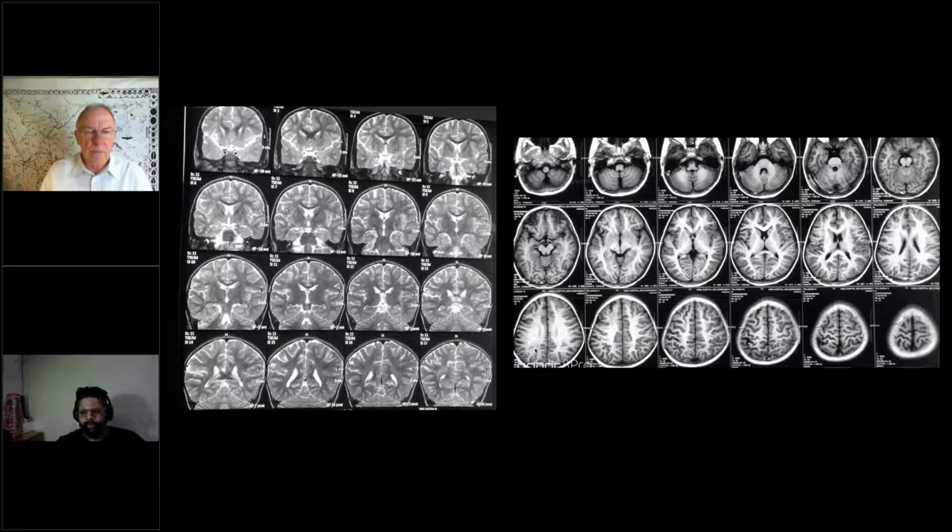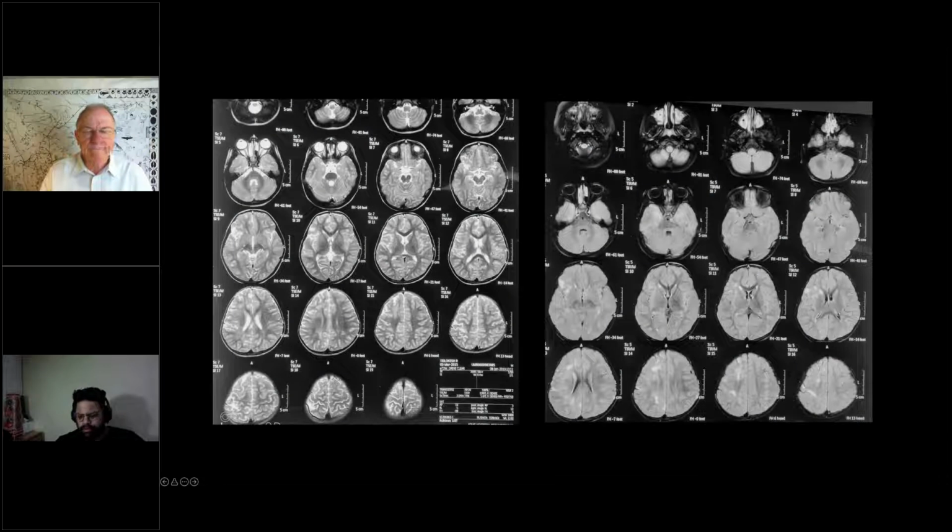Yeah, I think in the frontal there were some white matter changes, if I'm not wrong. On the left as well? I can't see that. If this is partially or not, I'm not sure, but either way, acquired injury, ischemic or infective in nature. And I don't think you need to go around looking for genetic basis either on these cases. Okay. Only those cortical changes were a little unusual for any form of hypoxic or hypoperfusion injury. The frontal opercular region and the central region. Okay.